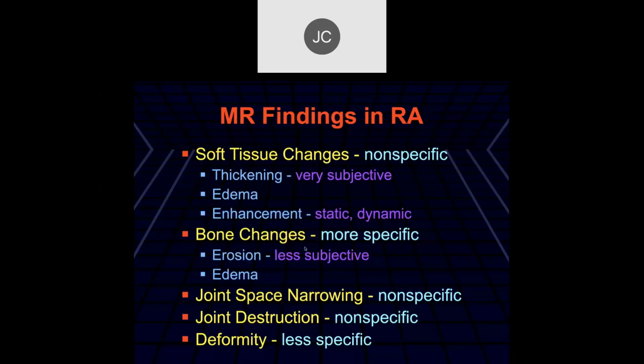And we've talked a little bit about how these occur. I'm going to talk a little bit more, I think, in a minute. Generally, in the area of the end of the bones in the hand, typically you start getting inflammatory disease in the subcortical bone where the capsule attaches, typically on the medial and lateral aspect of the metacarpal heads.